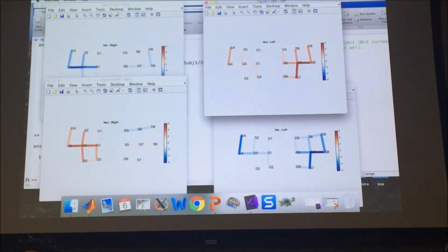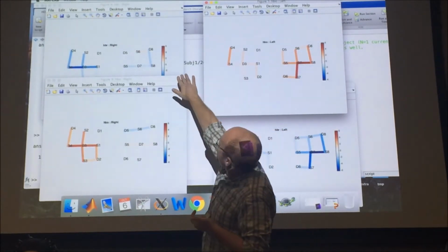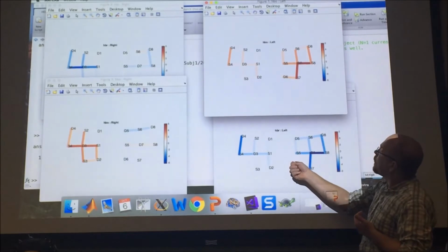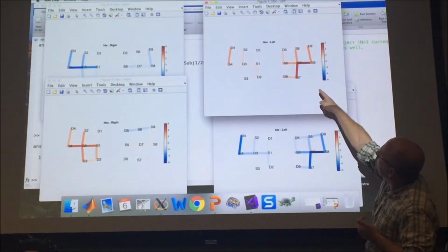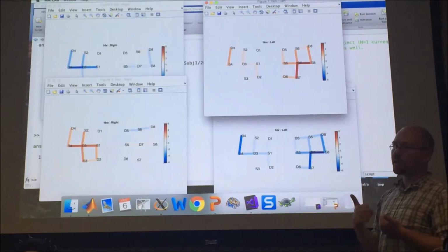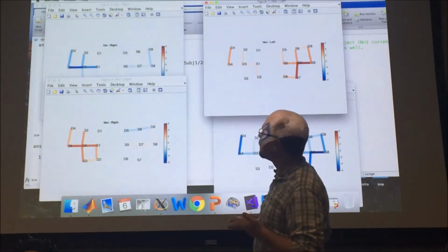And so the color scale here is the t-statistic. Did I do this right? HbO is on the right side, so we see brain activity on the left. HbR is on the left side. I'm sorry, I should flip those two images, but we see brain activity on the right, where we see oxyhemoglobin mirrors where we see deoxyhemoglobin. So oxy's going up, deoxy's going down, exactly like we expect it to. Thomas is a great subject, and we see this brain activity.